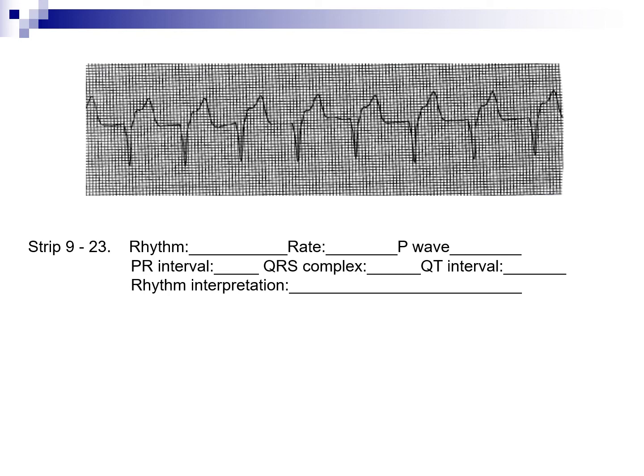9.23, in this rhythm, it is regular, and therefore we can do the heart rate. The heart rate is 88. We do not see any P's, so therefore we cannot do a PR interval. So the QRS is wide. You can look at the strip and note that this is a wide QRS, 0.12. The QT interval is 0.40.